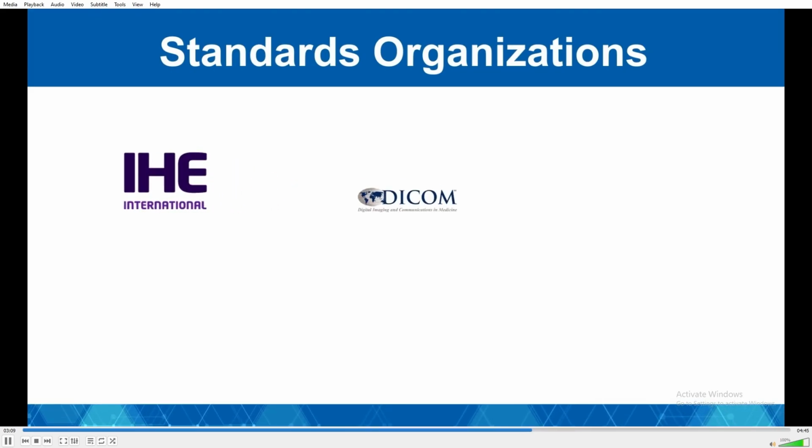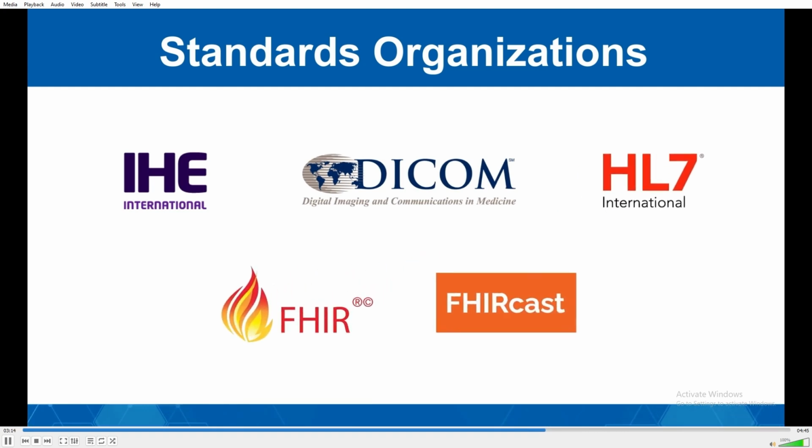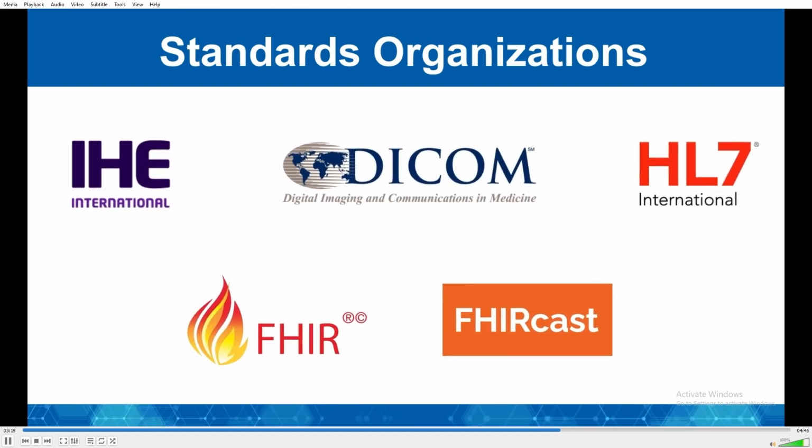You may have noticed that all of these different applications open correctly on the same patient. This is possible using FHIRcast. FHIRcast is a standard that synchronizes clinical applications, such as EHR, PACS, reporting systems, or AI tools, to a given study or a patient. It allows different applications to look at the same patient securely. The upcoming versions of the FHIRcast will also enable the exchange of measurements or AI findings.